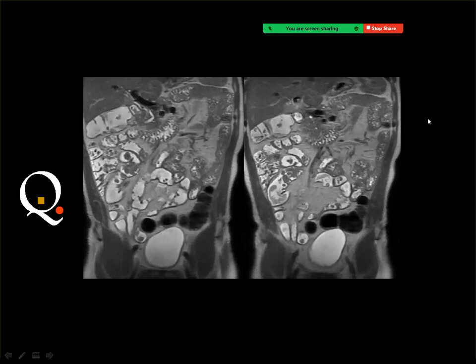Okay, and I hope that you have listened to the lecture about the MR enterography. This is a new one I added to the contents of the course. And you know before from the regular lectures that the small bowel does not contain filling defects. The small bowel contains fluid only. But if you see multiple filling defects within the small bowel, you know that these are polyps. But filling defects are routinely seen in the large bowel, and these are, of course, due to fecal matter.